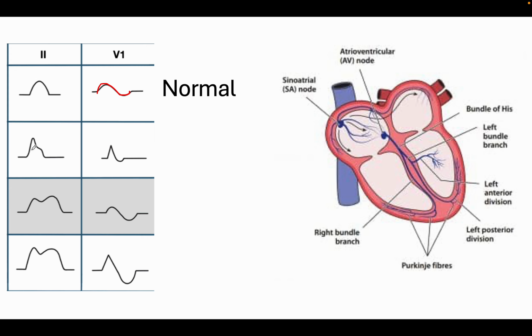Sometimes the P wave can look weird, and in this case the P wave has a taller amplitude, a bigger amplitude here at the beginning and then a smaller amplitude after. In the biphasic part, there's like a massive spike at the start, and this is basically representative of right atrial enlargement. So the right atrium here, where the sinoatrial node is, has basically stretched and become bigger.